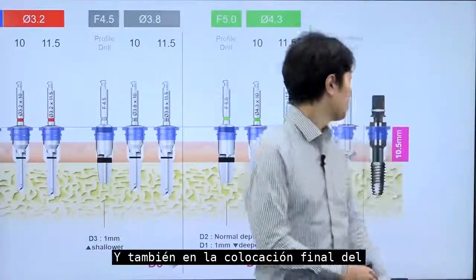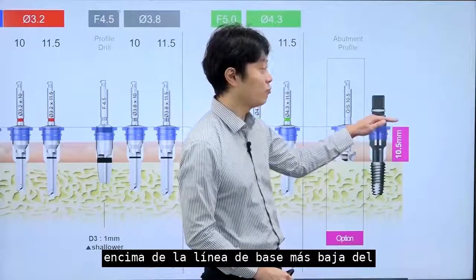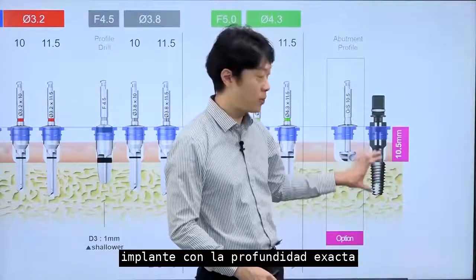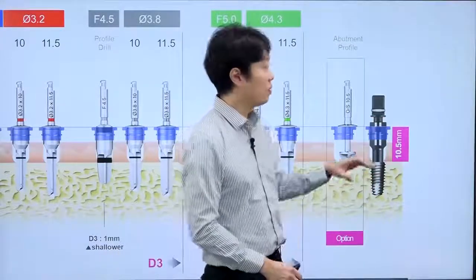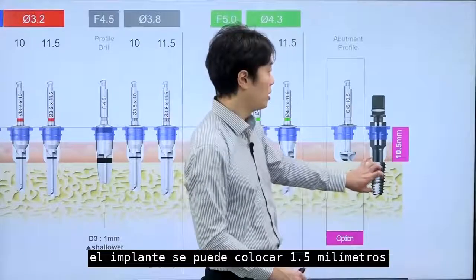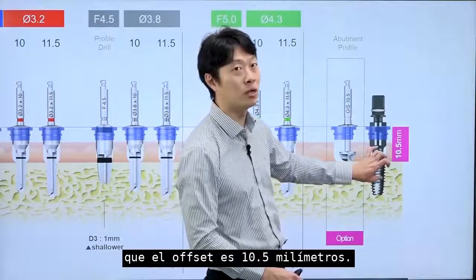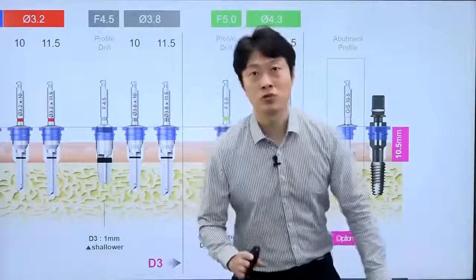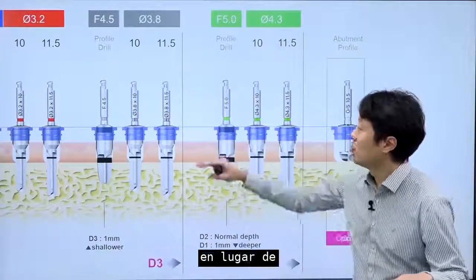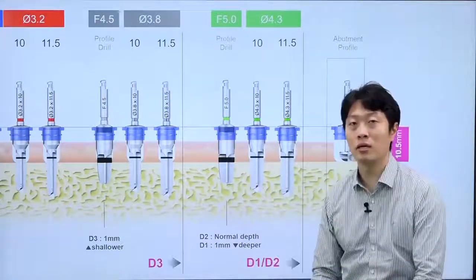And in the final implant placement as well, you should place the implant one space above the lowest baseline of the implant connector to position the implant with the accurate depth. If it is set 1.5mm shorter, the implant may be placed 1.5mm shorter from the target position since the offset is 10.5mm. So when the offset is 10.5mm or 12mm instead of 9mm, you should thoroughly check the depth and length of drilling.